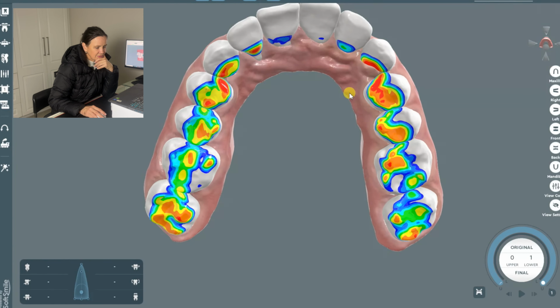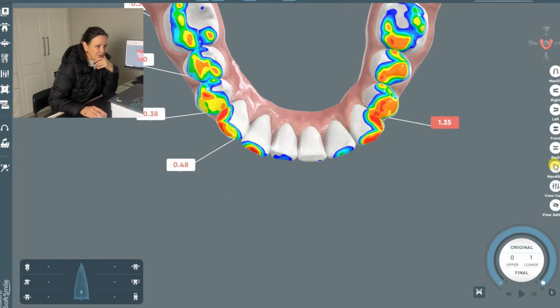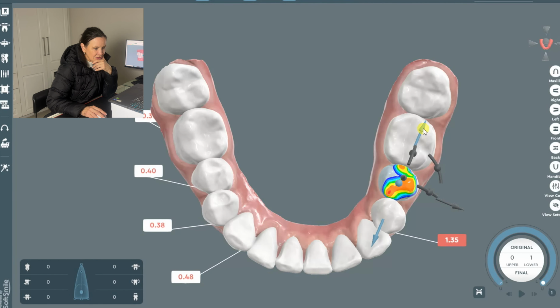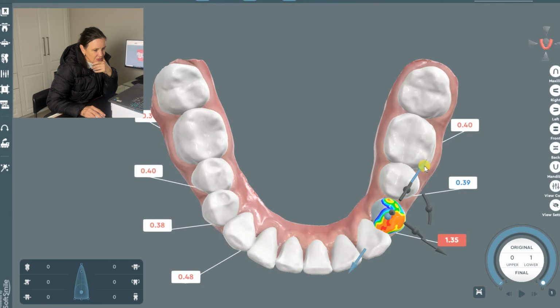Interestingly, on this side, it hasn't changed much. That's weird. On the patient's left-hand side. Oh, I didn't move the teeth, that's why. Patient left and bottom, I need to move them. Let's just do that quickly for the sake of illustrating my point.